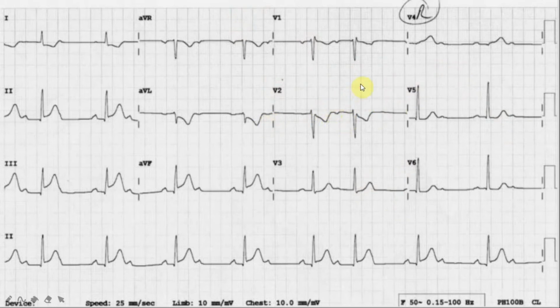Thank you. This is a very exciting ECG. I am going to interpret this ECG in a very systematic way. The elephant in the room in this ECG is ST segment elevation in the inferior leads and the non-conducted P waves suggestive of a second-degree heart block. I will come back to it in a second. Let me talk you through the usual stuff first.